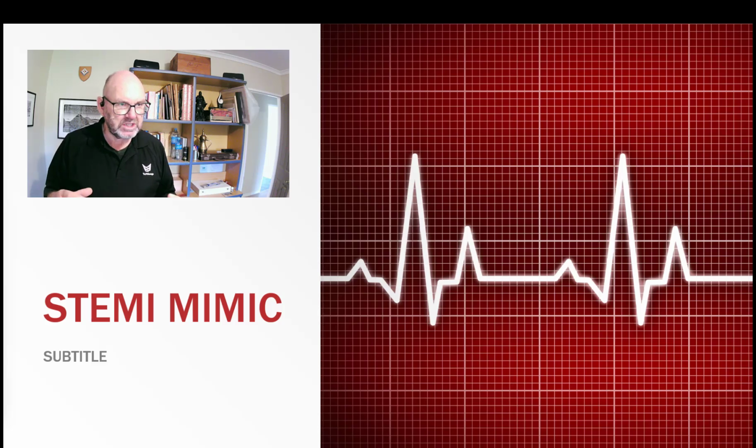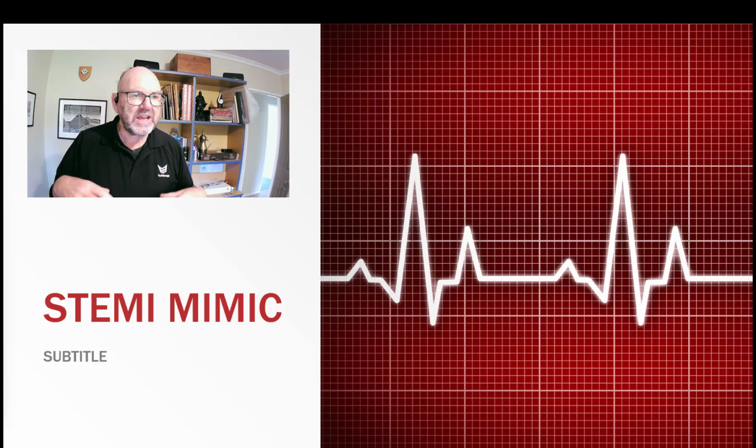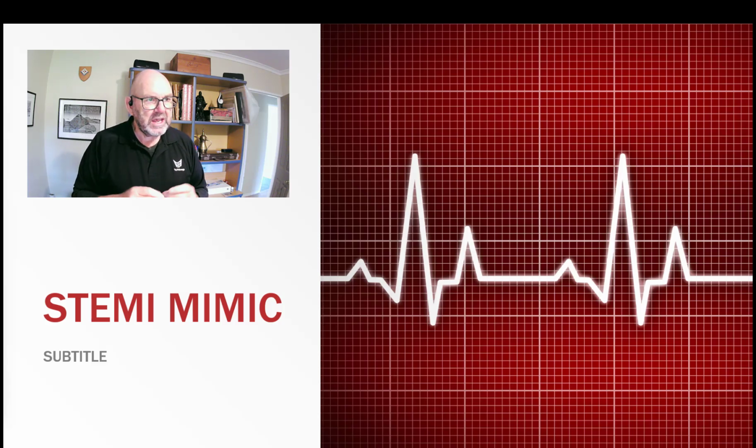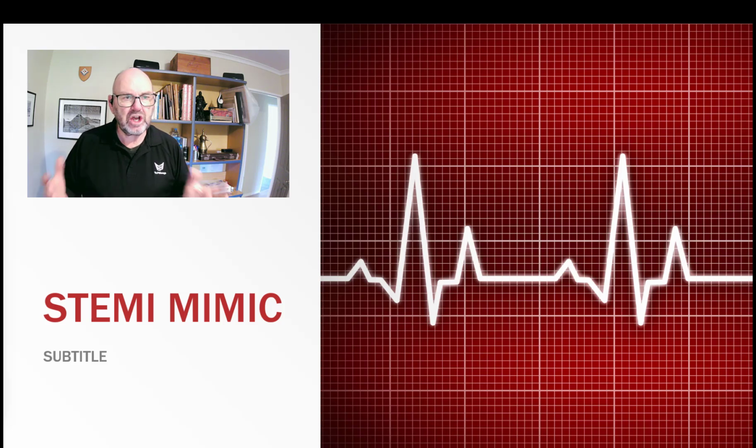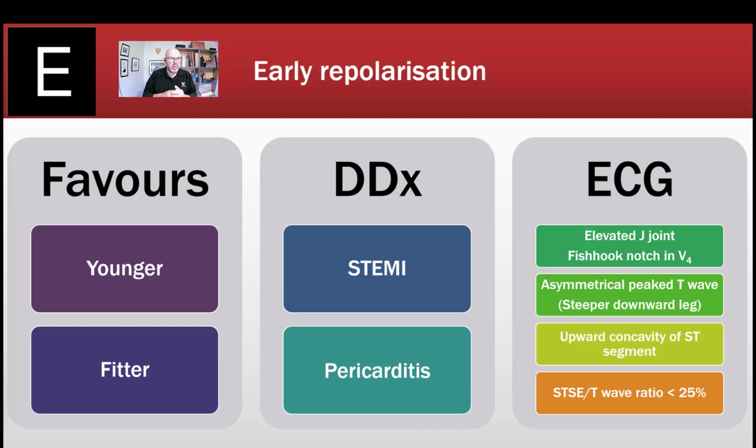And so the remainder of this presentation is going to focus on this. First, we're going to look at a physiological cause of ST segment elevation. And I say physiological because this occurs as a normal variant in some people and has no connection to disease or injury to the cardiac cells. Benign early repolarization is thought to stem from a physiological variation in which the epicardial tissue begins its repolarization phase a fraction ahead of the remainder of the myocardium. In this sense, it produces electrical currents not dissimilar to those seen between damaged and normal myocardial cells.